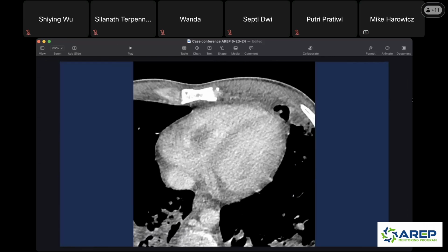This is how you get your higher order thinking of these people, right? When you see septic emboli, you need to think, can I find a source? So you should be looking at the heart and looking at the valves specifically. Now, on a regular chest CT, you're rarely going to get a very clean, crisp look at the valves, right? But that's not what I'm saying you should be looking for. What you should be looking for is big blobs that look like this. So this is a hypodense ovoid opacity here.